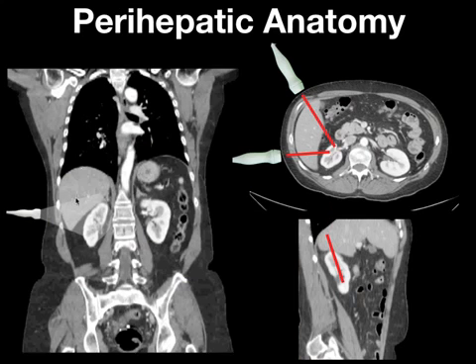Using CAT scan reconstructions, you can see here how the images are obtained from an anatomic standpoint. So here you've got your transducer, indicator up towards the head. You're shooting in through the subcutaneous tissue, in between the ribs here. You're going to see liver, the space between the liver and the kidney, which is Morrison's pouch, and here's the kidney here.